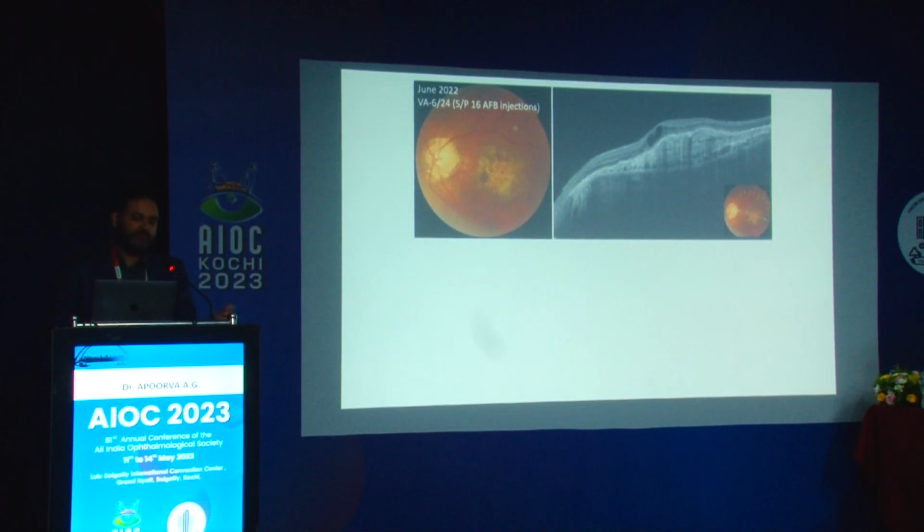This is 5 years follow up, and now it's your typical garden variety multi-layered PED, which is tight, which is compact, with alternate hyperreflective and hyporeflective vertical lines which are parallel to the retinal pigment epithelium, and may or may not be associated with the prechoroidal cleft. It was there at the outset when it began, but with treatment, these can tend to collapse as it did. And some people have looked at a prechoroidal cleft maybe being an indication for treatment and also having some prognostic significance.